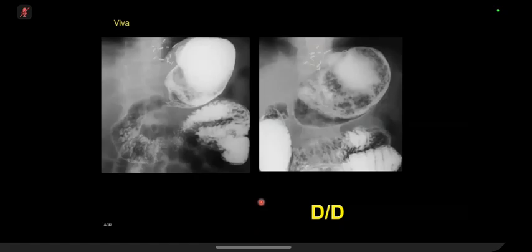It's more rounded rather than conforming to the normal stomach shape. On the second projection, the large area with the pooling of the contrast has moved. I wonder if that's rotational because of patient positioning or secondary to an internal structure such as food material or bezoar. Excellent. Okay, I'll take over.